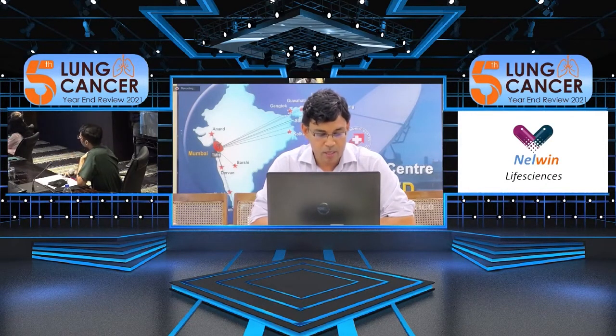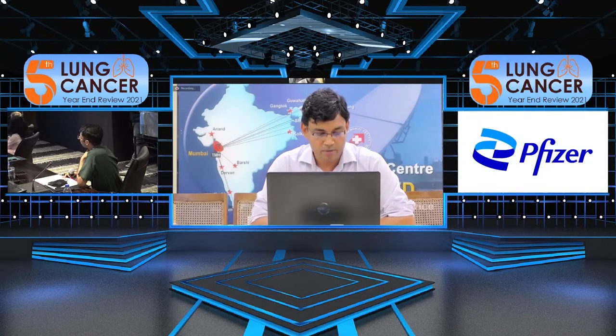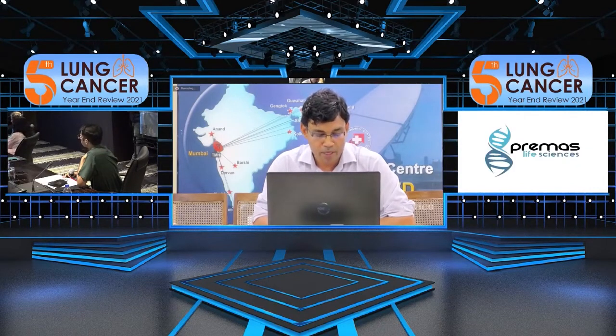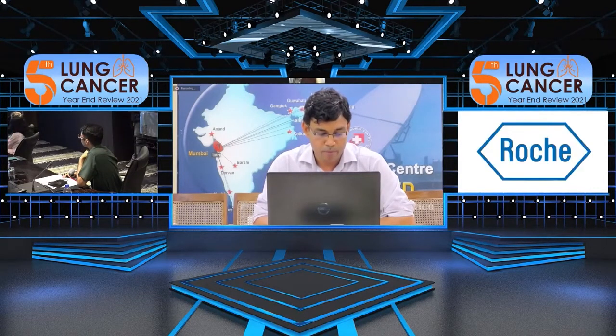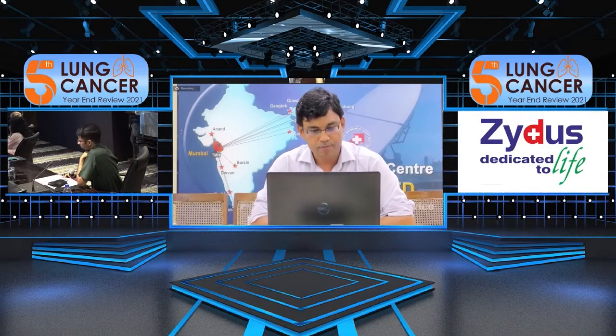Yeah, but other sequences are also important, because if you are picking up a lesion, then we have to characterize it, whether the enhancement is coming because of a metastasis, or it is some benign entity, or some primary brain neoplasm that is giving us the picture. That has to be differentiated based on the other sequences I have mentioned.